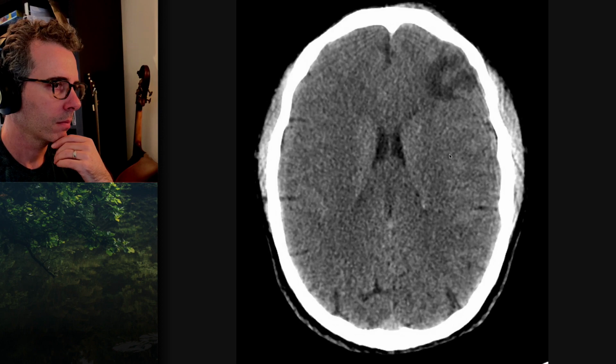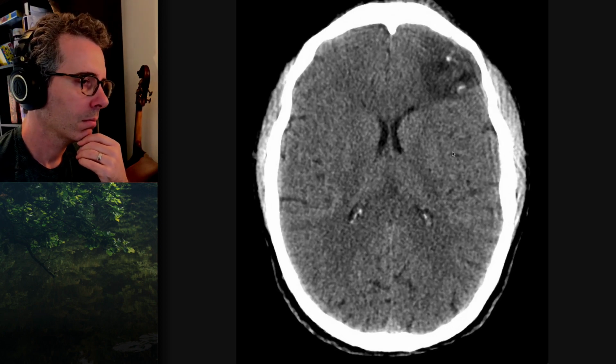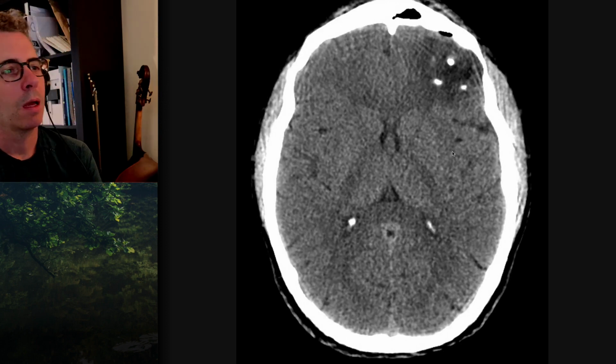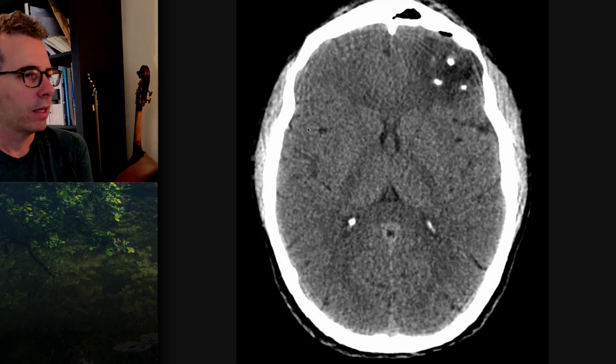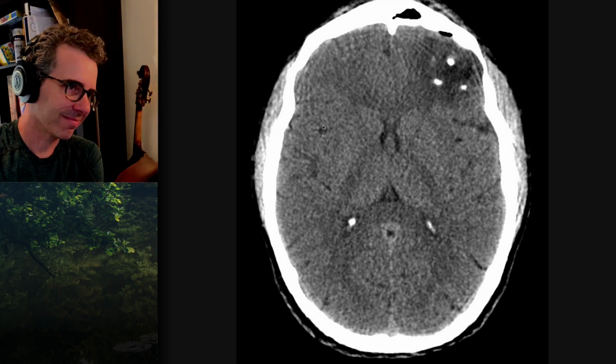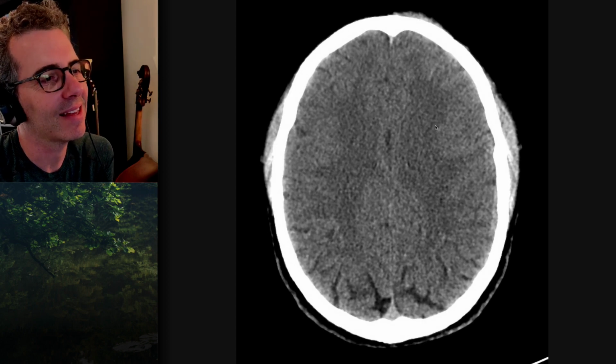One thing that I'm trying to work out is the bony fragments in the left frontal lobe. Has that arisen from the orbital roof, or is there another process at play simultaneously? But in the setting of trauma with that contusion, I favor it to be bony fragments from the orbital roof, and that is exactly how it was reported. Oh, okay. But could it be an oligodendroglioma there as well?